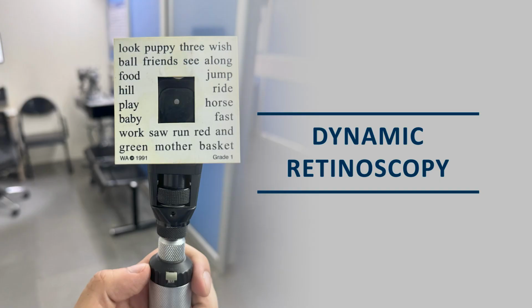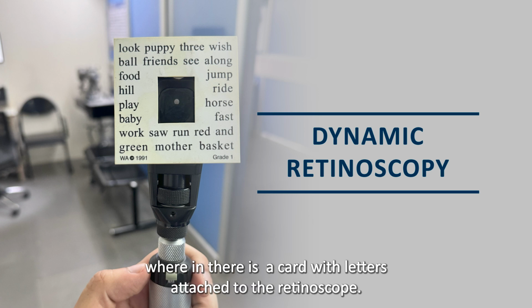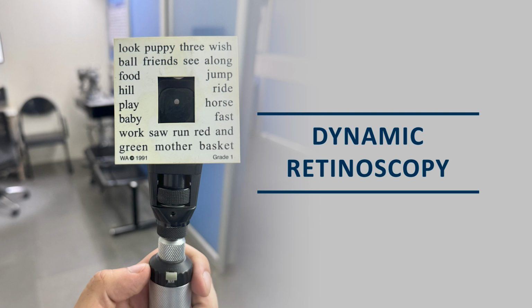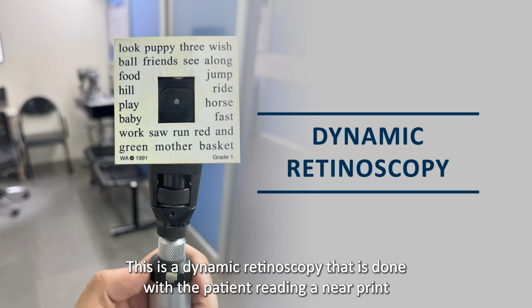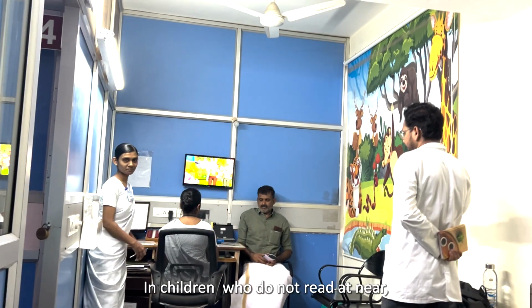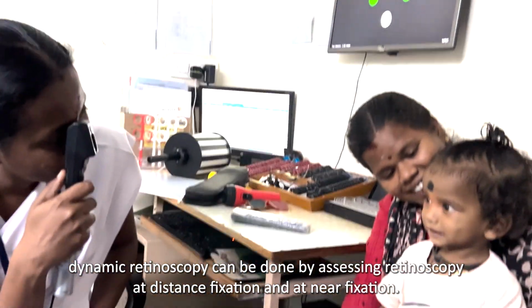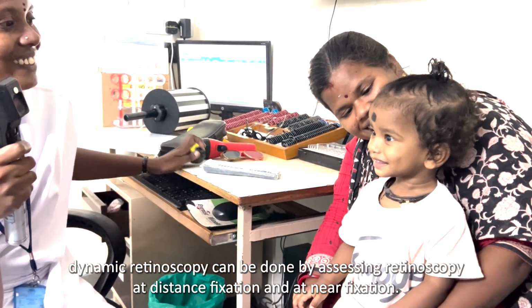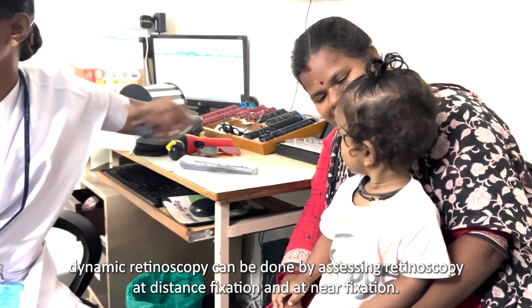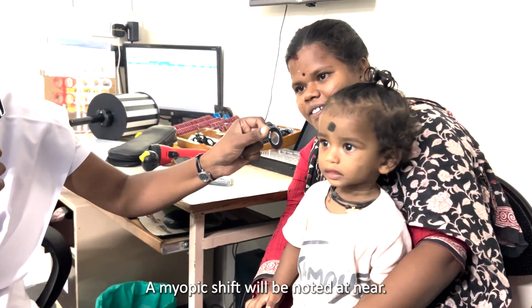Dynamic retinoscopy. Accommodation assessment is done by MEM retinoscopy, wherein there is a card with letters attached to the retinoscope. This is a dynamic retinoscopy that is done with the patient reading a near print and accommodation is assessed. In children who do not read at near, dynamic retinoscopy can be done by assessing retinoscopy at distance fixation and at near fixation. A myopic shift will be noted at near.